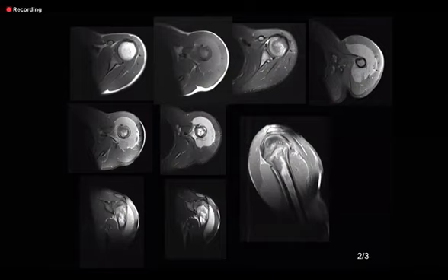If you see an intraosseous abscess, just like the first case we covered today, then you are very confident about osteomyelitis. So this is Ewing's, and call it that. If an examiner is grilling you, for example, asking a leading question, can it be osteomyelitis, then your confidence should still be there.